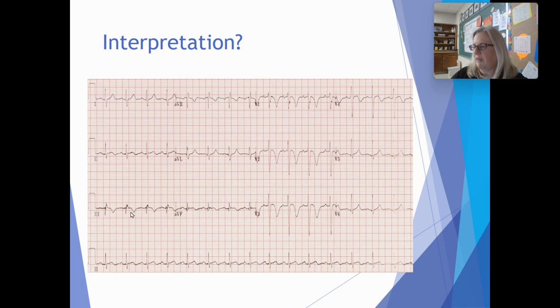This actually looks a little elevated, but what I'm more concerned about is this inverted T wave here and inverted T wave here. I don't see much of a change here. It might be an inverted T, but it's not complete. So I see change in 3 in AVF, which means we do have a change inferiorly, and it's just slightly inverted. So it's not scary inverted, but something to look into.